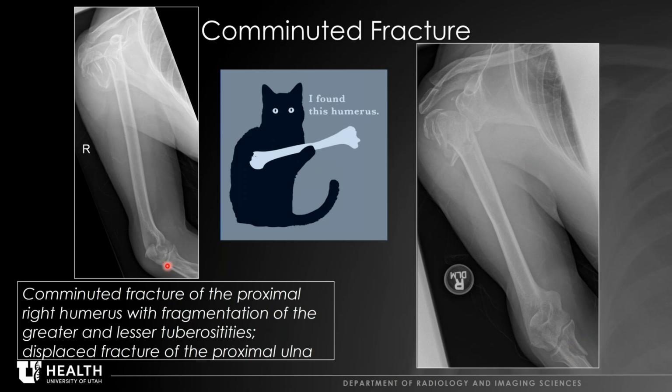So we talk a lot about edge of view or corner fractures. When we talk about that, we're talking about here, this fracture is at the edge of our field of view. And we see this fracture, and it's really comminuted, a lot of displacement, and then we don't want satisfaction of search and miss any other fractures. So like Amanda said, where there's one fracture, there's usually multiple fractures or 2 fractures, so we have to look everywhere on the images because we're responsible for it. I mean, even here, if there's a lung cancer right here, we're responsible for it as radiologists.